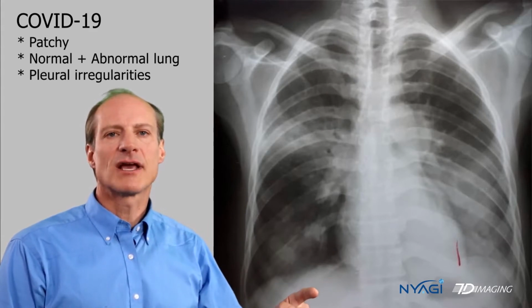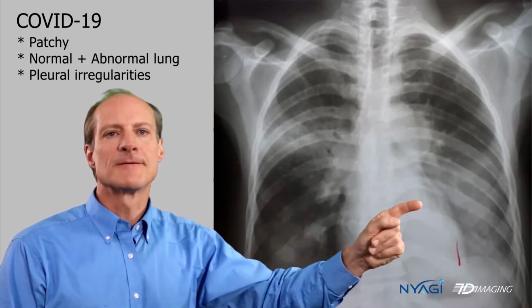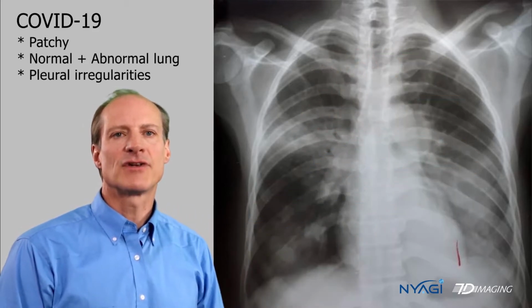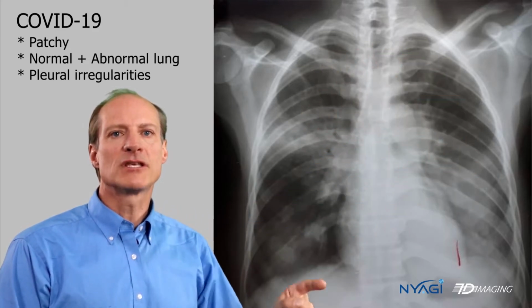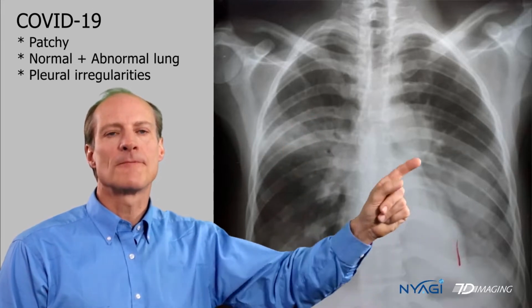As the disease progresses, the areas of consolidation get more and more condensed. This causes a whiteout of the lung in the very severe cases. There may only be small little patches in very mild cases, if patches at all.